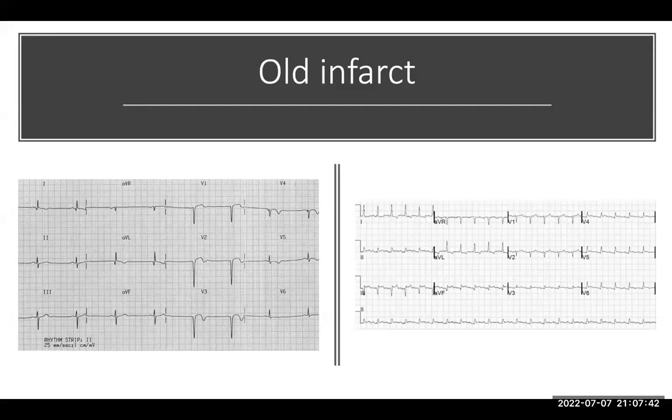But if that Q becomes very deep, in other words, if it's reaching more than a third of the corresponding R wave, that's also a pathologic Q wave. So we have pathologic and non-pathologic. The small Q waves in lead 1, AVL, V5, V6 are non-pathologic and it's a common thing. But if that Q wave starts getting deeper, until it's very prominent, then you can start talking of a pathologic Q wave.